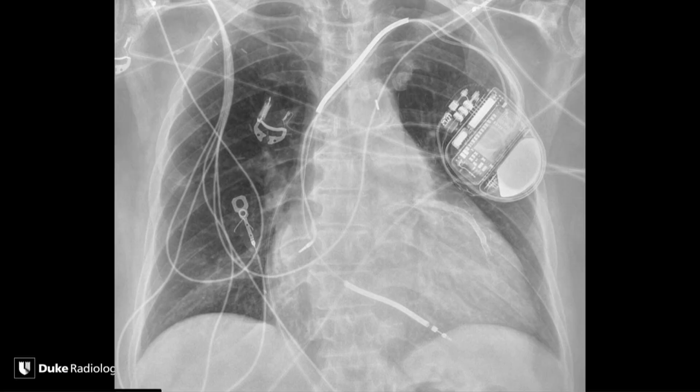And so this is a balloon pump catheter. This is a typical femoral balloon, so it's placed from a femoral approach. There's the marker. It's about 1.5 centimeters from the superior aspect of the aortic arch. That's a good position. And notice that if this balloon has a marker at the proximal end, it has been coned off the chest radiograph. Now, does positioning really matter?